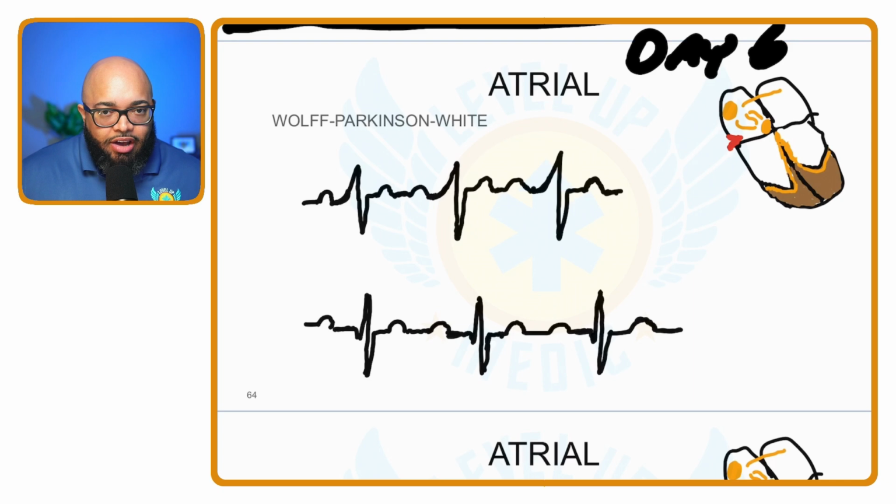Now, let's go down to the ventricles. For the atria, I said there are 4 steps: the atria are at rest, depolarization, contraction, and repolarization. We're going to have the exact same 4 steps down in the ventricles. The ventricles are at rest. That's this PR segment. Then the ventricles have to depolarize. They have to get excited. They have to have positive energy going into those cells. That happens during the QRS.